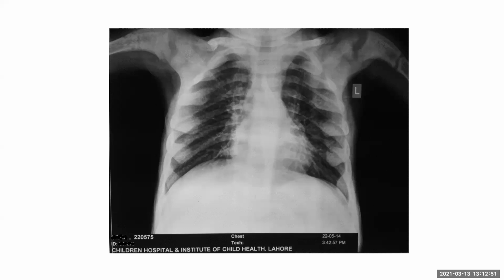increased bone density and expansion of the anterior ends of the ribs, and also diffusely abnormal metaphyseal regions of both humeri with multiple fractures. So I will see whether this patient has any previous films and also look at the clinical history and see if there are any other skeletal radiographs available.